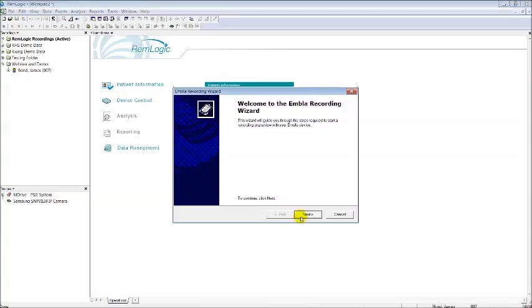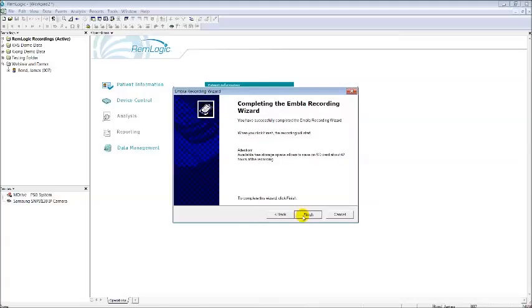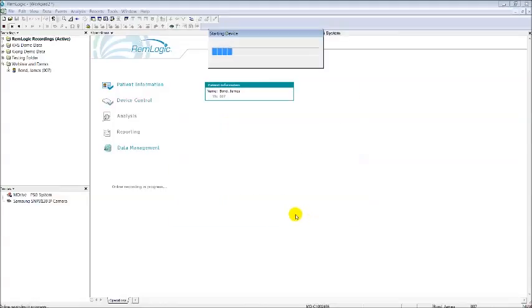You can customize a profile just for the MSLT test. I'll click next, finish. For the MSLT test, you can also customize your own workspace, especially for MSLT. I'll show you more when my workspace is loaded.